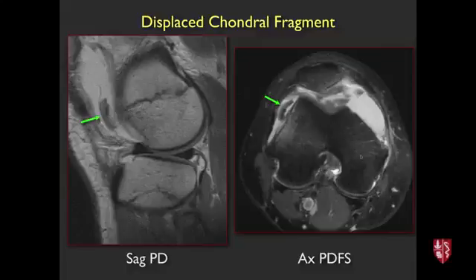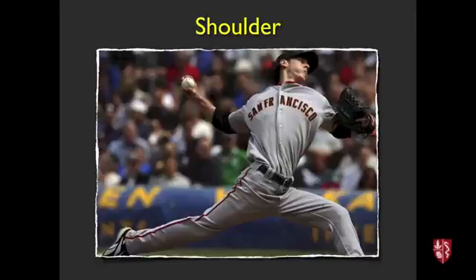This is a younger patient who had a dislocated patella. So here's the axial scan, here's the patella, the kneecap, right? Patella usually dislocates laterally, and so this bone transiently was way out here. And it's relocated, which it usually does as you extend the knee, but he shaved off this big chunk of cartilage here. And that's a really important thing for us to detect, because that may be the difference between this patient getting surgery or not. So a displaced fragment of cartilage from a patellar dislocation.